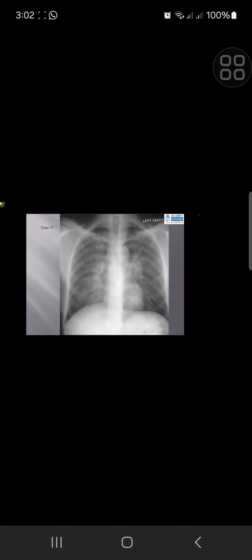I suspect that there is increased bilateral hilar lymphadenopathy. In summary, I have bilateral upper and mid zone reticular and nodular opacities with bilateral hilar lymphadenopathy. I cannot appreciate a right paratracheal lymph node.